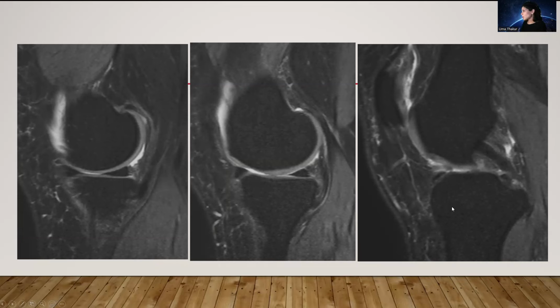And then on this sagittal image, you see this anterior root of the medial meniscus, which can have this normal draped appearance over the medial tibial plateau, and the posterior root of the medial meniscus, which can have a normal speckled appearance, not to be mistaken for a tear. You also happen to start to get the origin of the PCL, which is nice, dark, and contiguous.